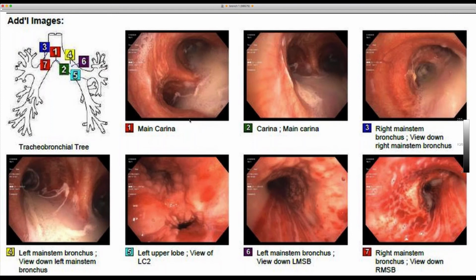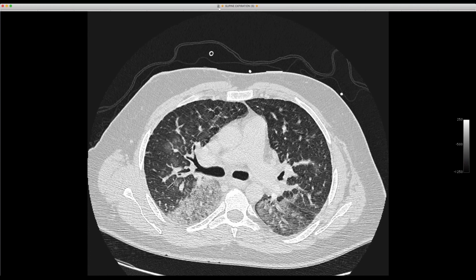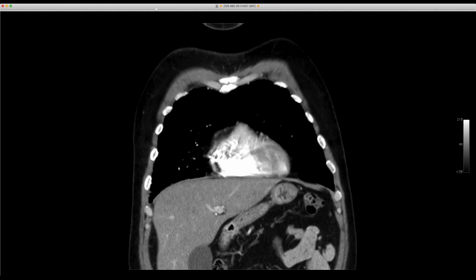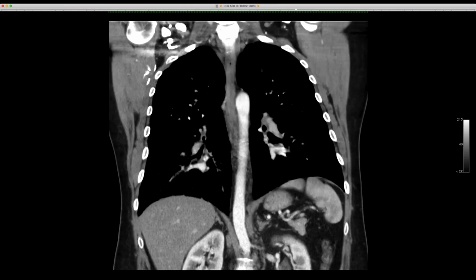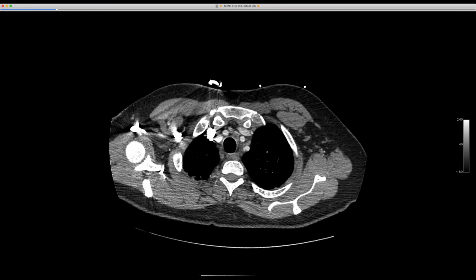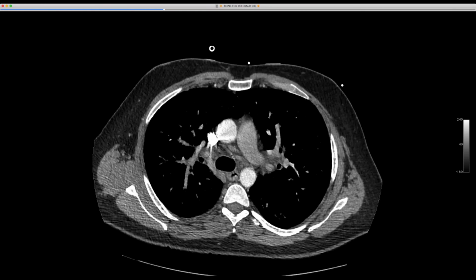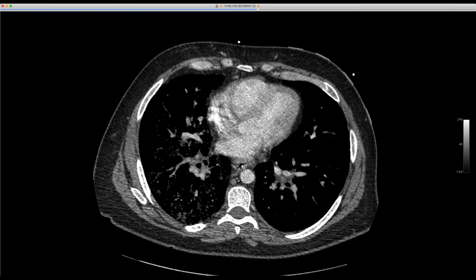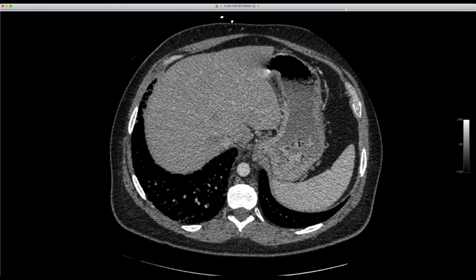All right. And then he got CT'd again back in September, and you can see it recurred in exactly the same place. A couple other imaging findings to share. Let's see on this coronal, you can see there's what looks like lymph node enlargement in the mediastinum, and I want to find the transaxial ones here. Here we go. And we can see there is all this what looks like lymph node enlargement in the mediastinum. The fat isn't completely normal, and if you look back here, azygous vein, there's some tissue in the area of the thoracic duct, so it looks like a dilated thoracic duct.